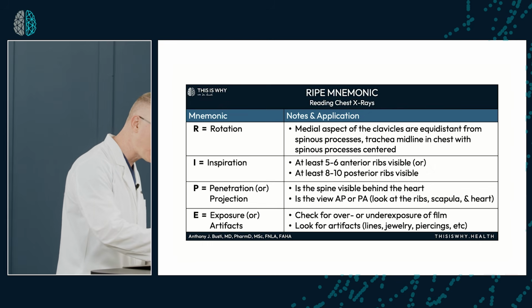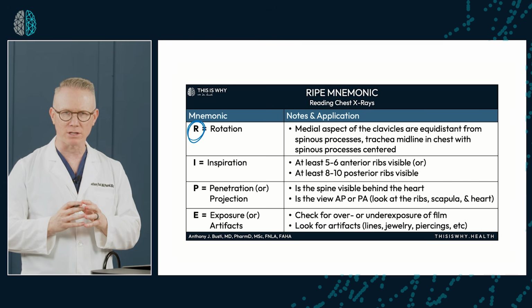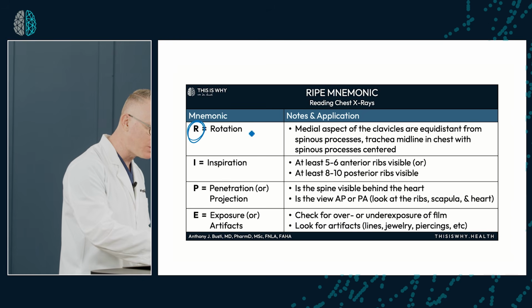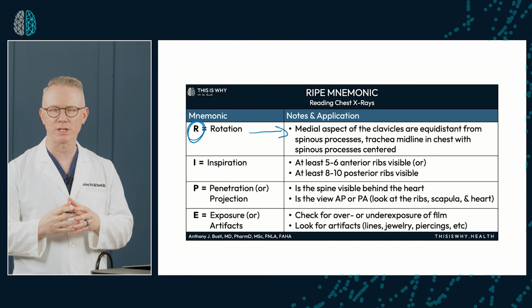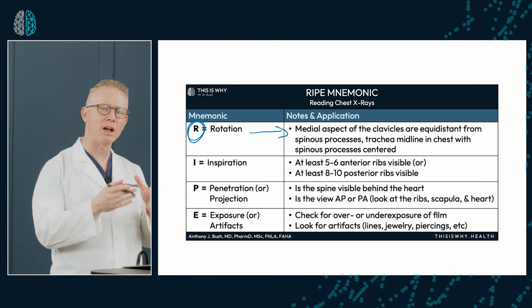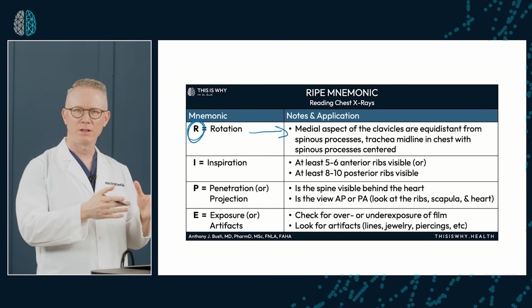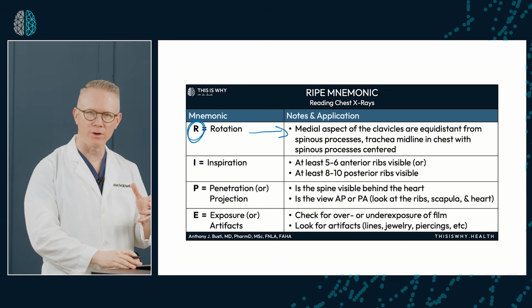And the very first thing up there is, is there any rotation of the patient? And there are some criteria that we use to help us discern that. And I'm going to walk you through those here in just a second. But I wanted you to see that in the context of why we teach these mnemonics and how they fit into the bigger picture of other mnemonics.